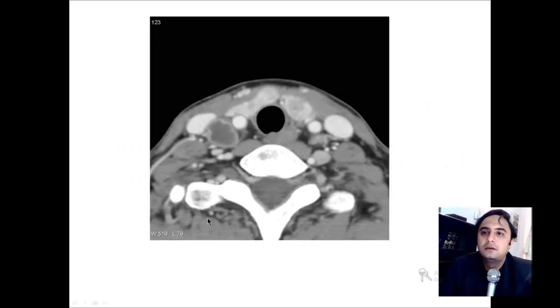Here you can see on the right side there is a cystic node that is present between the internal jugular and the common carotid artery, which is pushing the internal jugular way beyond its limits. A large node with the cystic change, so see the attenuation level and see the well circumscribed rim and the hyperdense area surrounding it. This is a node not present on the other side. This is basically the level 4 of the neck. Here you see the thyroid gland.